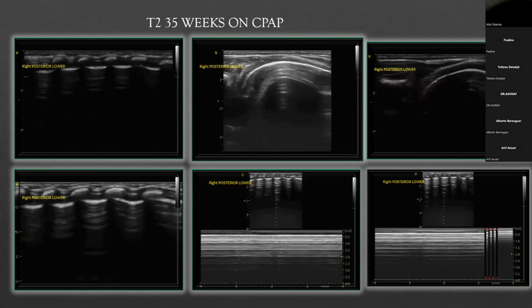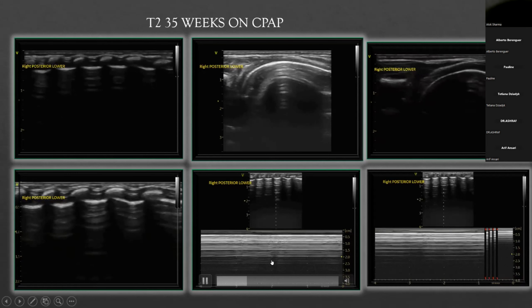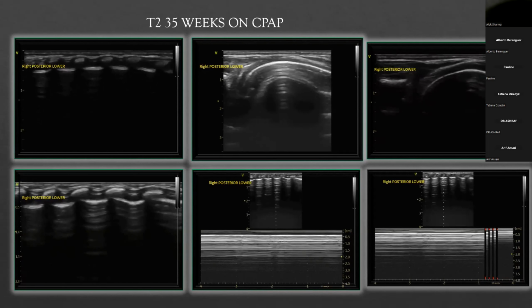And do you consider a lung point in the upper? Yeah, so let's say, can you see me? Yes. Okay, so let's say I've got a small pneumothorax that's extending all the way down here. I might have air in this region, but absolutely no pneumothorax in the rest of the lung. It might be so small. So my lung point will be lateral, but it will also be inferior.